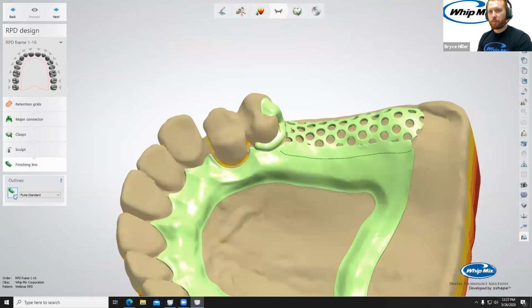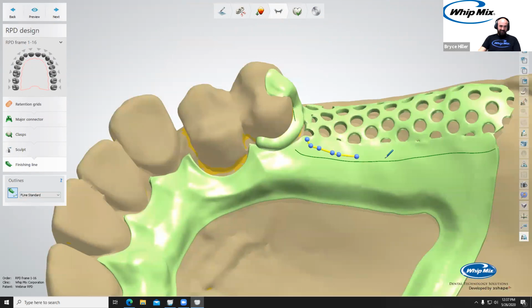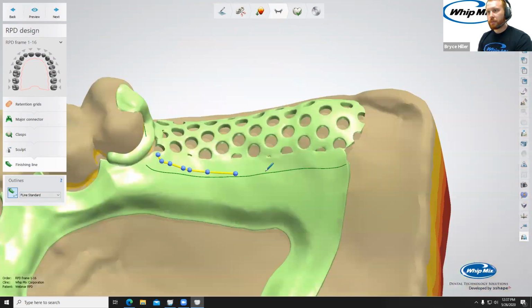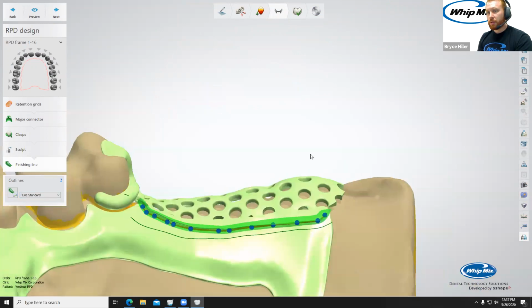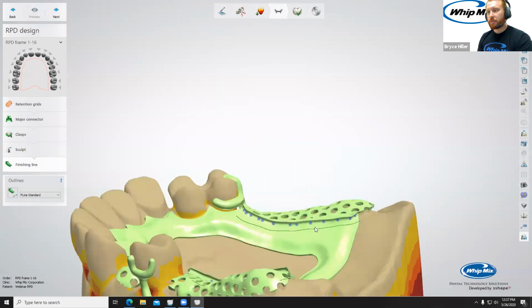Now the next one I'm gonna draw left to right and show you how to reverse it because it's gonna generate not properly. I just learned something new today. Yeah, it took me a while to figure that out. So now it's facing the wrong way. So obviously that ain't gonna fly.